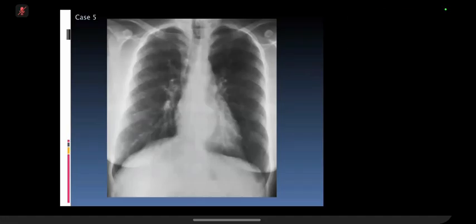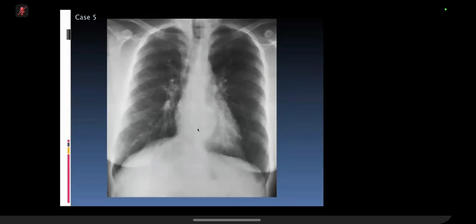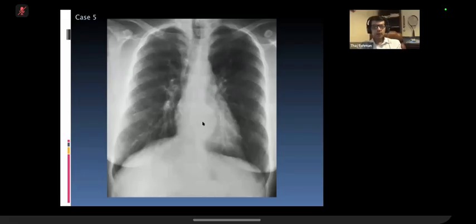Okay, so onto radiograph of the chest. There is a left retrocardiac shadow. Very good, yeah. It looks like it's basically coming adjacent to the paravertebral line, so it looks like it's a posterior mediastinal mass. So that's very good. Posterior mediastinal mass has got a broad base to the spine. If it was in the lung, you would have seen some lung, or at least some angle with the mediastinal, the paraspinal border.